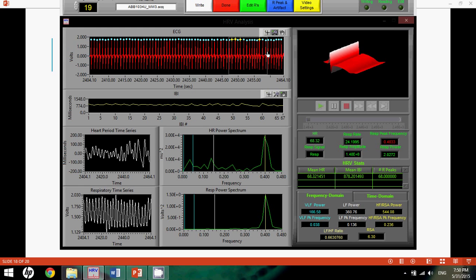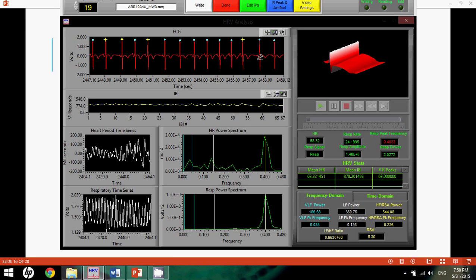In this case, I believe it actually is an indication of great health on the participant's part, just for the fact that they have this natural physiological variability. So the yellow stars don't necessarily mean a bad thing. In this circumstance, we would actually keep this segment and consider it a positive.